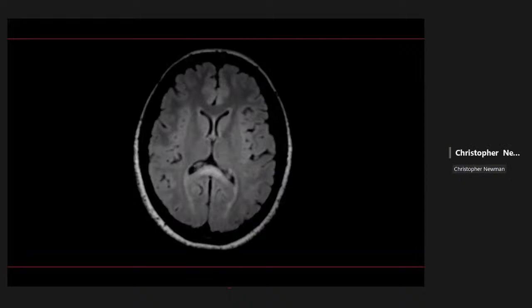Yeah, so focusing on that abnormality in the splenium, have you ever seen that before or know what that might be? I have seen it, but I'm blanking on what causes that. Yeah. There are actually a lot of things that cause this lesion, and also a lot of names for it. So anytime something has a lot of names, I feel like it's even harder to remember any one of them.